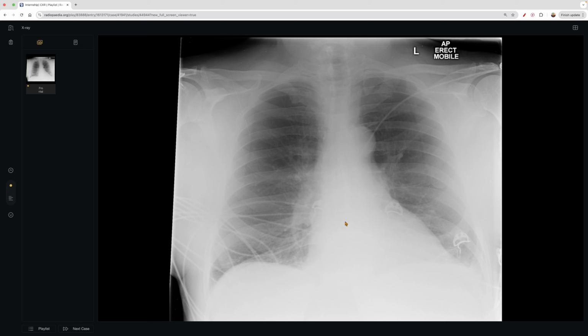Aside from that, when we say the penetration, you can say penetration synonymous with strength. So if the X-rays are stronger, then the image is going to look darker, versus if the X-rays are quote unquote weaker, then it's going to look brighter. So this is underpenetrated, and we know that because the structures here are very bright. And so what I mean by that is the idea that when you have a very dense structure, such as bone, for example, it actually absorbs the X-rays. So what we're seeing here is the lack of an X-ray onto the detector, really. With that being said, you can also see here like all the soft tissue. Body habitus can change this as well, but we can't even see the heart.